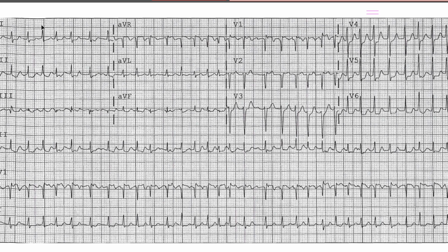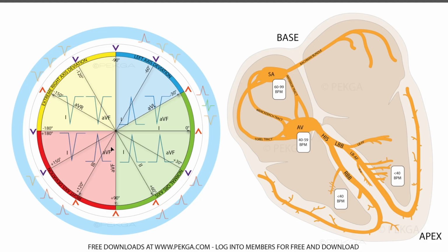So when we get to the 12 lead, I'm just going to take a look at the axis of depolarization. It's just a habit I have. So, upright in 1, upright in 2, 3, it's difficult to say. Maybe it's upright, maybe it's not, but AVF is. And this is enough to say to me that, let's see here, if you were to look at lead 1 and AVF alone, so here's lead 1, it's upright. Here's lead AVF, it's upright. We're in the bottom right quadrant, so this is a normal axis of depolarization.